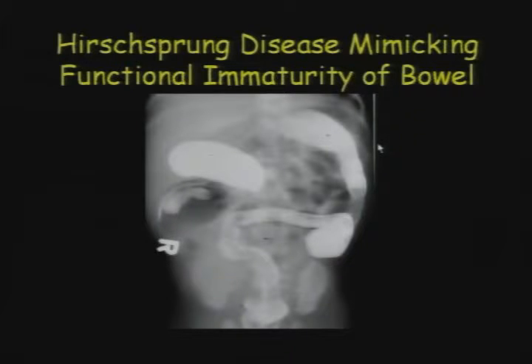Now, one other thing I will caution you with is that you can't always tell where the transition zone is in Hirschsprung's disease, and the transition zone can be anywhere. And this is a case where you'd say, oh, gee, this looks just like the case you just showed me of small left colon or functional immaturity of the colon. But this was path-proven Hirschsprung's disease. So whenever I see what I want to call a small left colon, I always at least talk to the clinician and say, look, now that I've done this enema, if this baby doesn't start stooling normally, think about Hirschsprung's and consider biopsying.